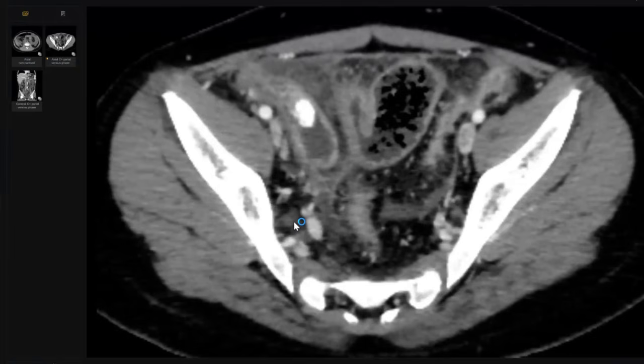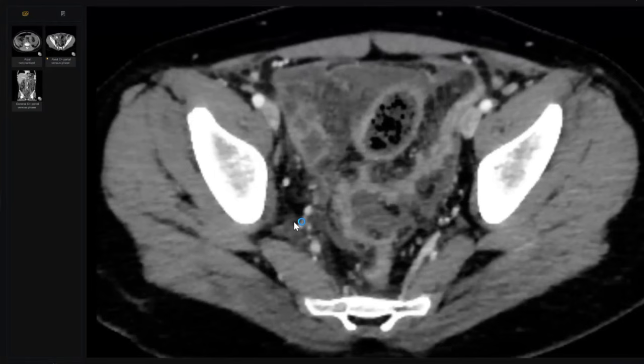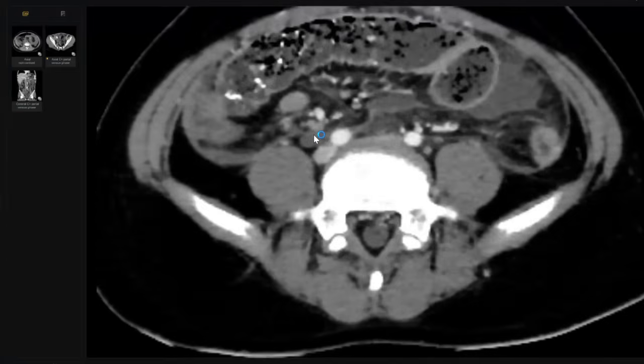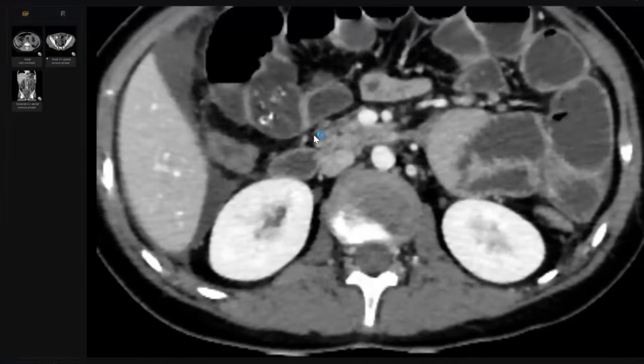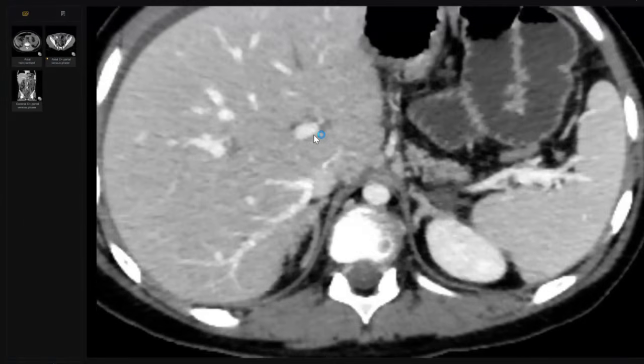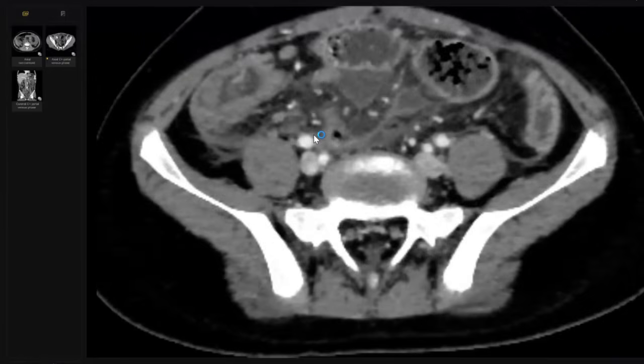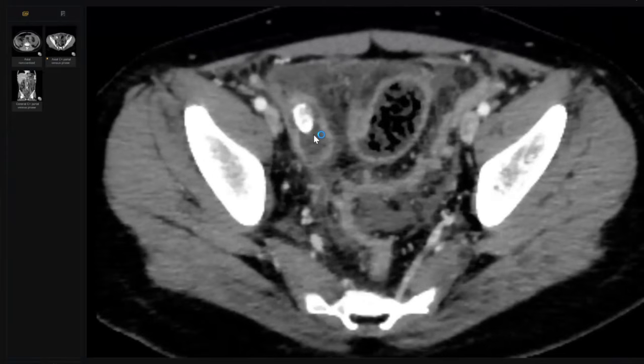This patient came in the emergency and the surgeon wants a report, like yes or no, a close-ended report. Okay. Sir, I would like to see the upper abdominal images as well to rule out any other etiology. Okay, I cannot see any air within the biliary or portal venous region, and I cannot also see free air. What's your final diagnosis?